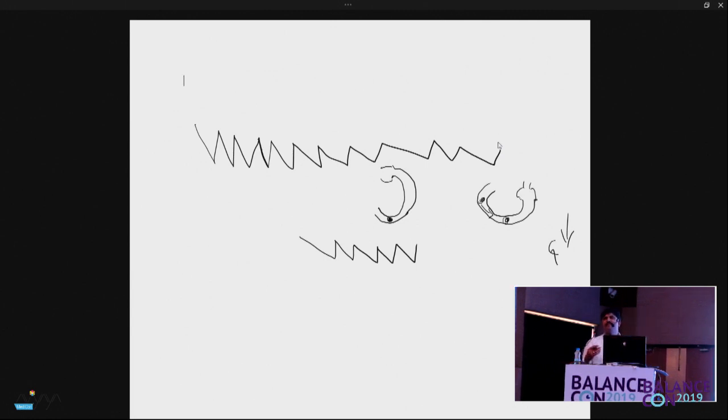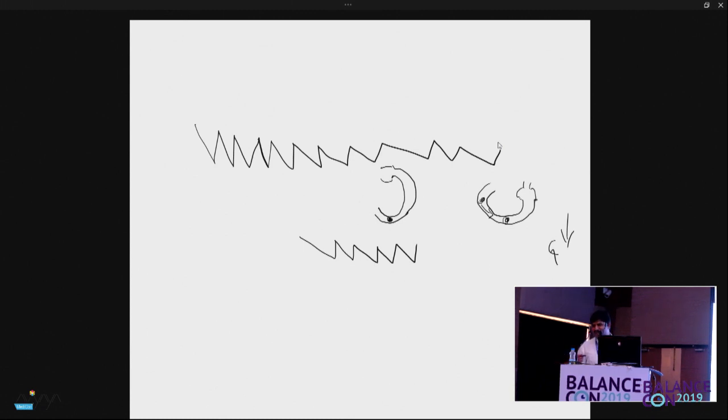We are used to saying that vestibular is slow phase and saccades are fast. But sometimes in the lateral canal, the slow component or the vestibular component is so fast that it is comparable to the saccadic phase. That is why in the beginning you can't make out the difference. But as you see further, can you make out that there is a right beating nystagmus here in the second graph? All of you can make out, please raise your hand. There is a right beating nystagmus.